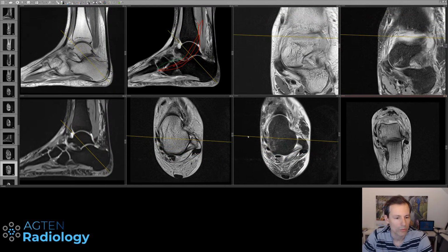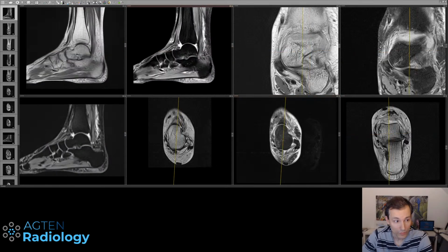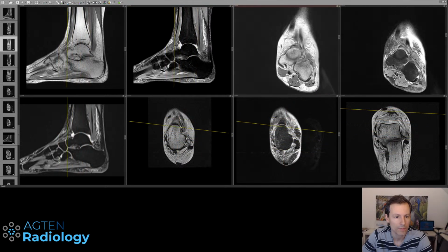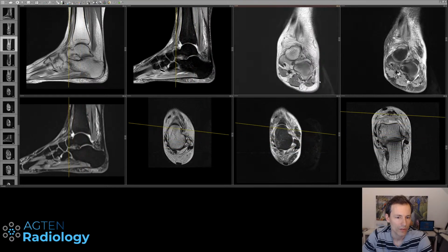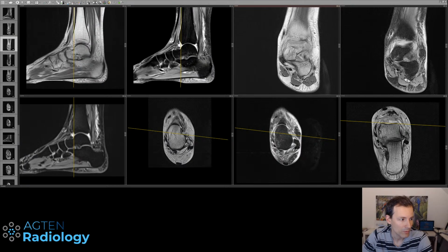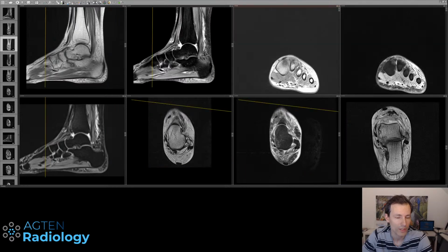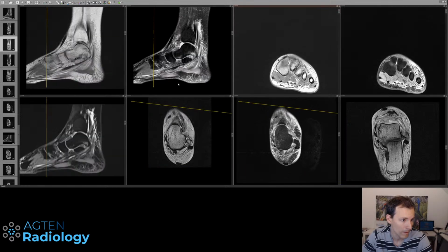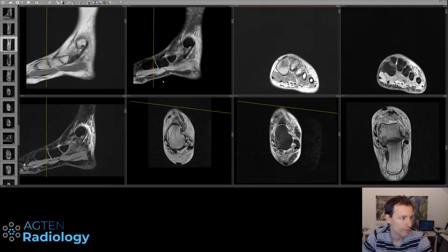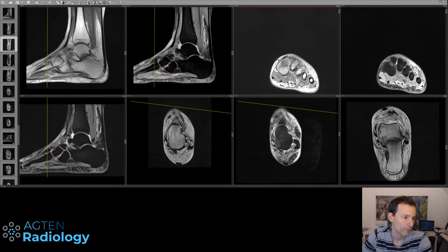Then moving on to what's left, soft tissue. So with soft tissue, always assess the musculature down here. Sometimes you can see fatty atrophy of these muscles, which might indicate a nerve entrapment, which is not the case here. In diabetic patients, you will see a severe fatty atrophy of all of the intrinsic foot musculature. But here we are just checking for hematoma, something like this, because I think it's a young patient. Yep, nothing special going on.